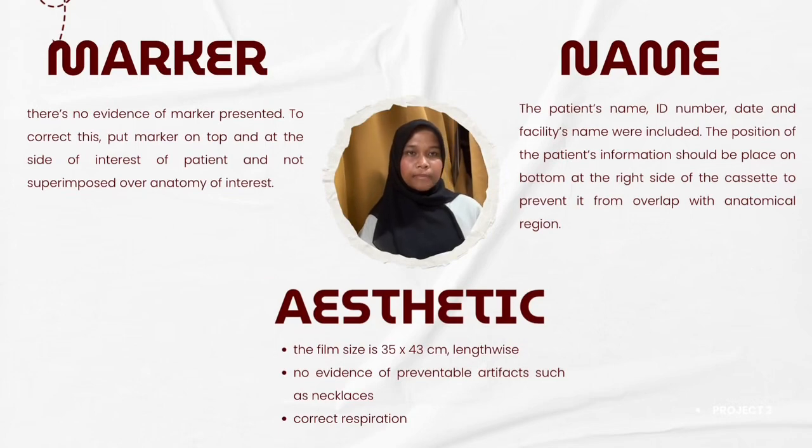So let's explore the marker. There's no evidence of a marker presented. To correct this, put the marker on top and at the side of interest of the patient and not superimposed over the anatomy of interest.